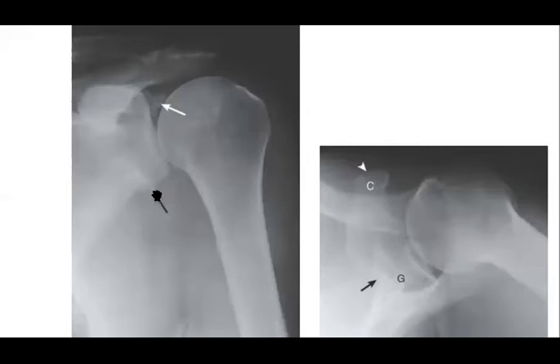So do you find the appearance of, yeah, the glenoid and the separation of the bone? So you will expect that it could be a dislocation and there is a Bankart injury, and a bony Bankart, because already you see the osseous separation here. And sure, if you go to the CT, it will be much easier to recognize it, right?